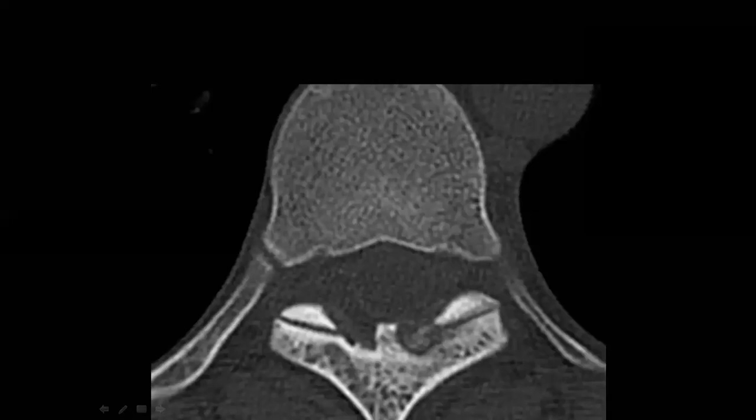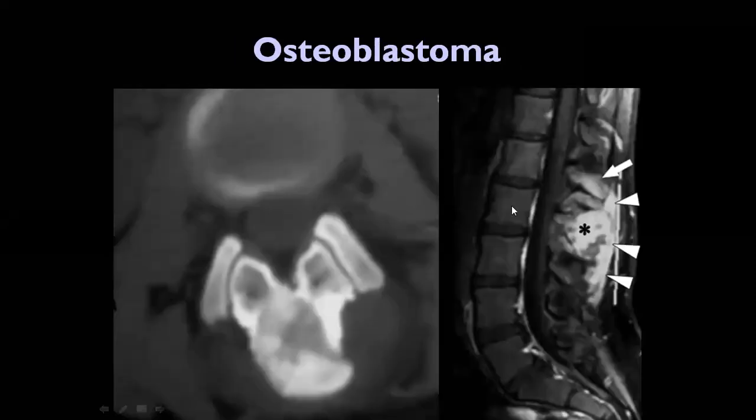I am fixed to show you this because, osteoid osteoma. Not everyone knows what it is, but that could be it. And when you find this osteoid osteoma, don't forget it, because he will ask you what could be the next step and what to do. There is a treatment now, they do it with radiofrequency ablation. So maybe some discussion about this. So this is the differential of this, and also the isotope scanning. It will be hot in the isotope. So the differential of this lesion is the osteoblastoma.